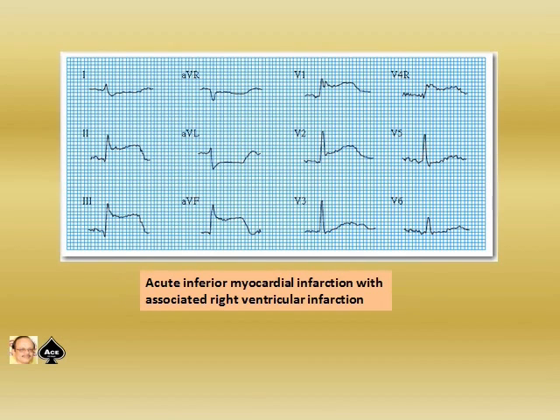Acute inferior wall infarction with associated right ventricular infarction is shown in this picture. So please go through this picture carefully. I will show this for some more time for you to memorize.